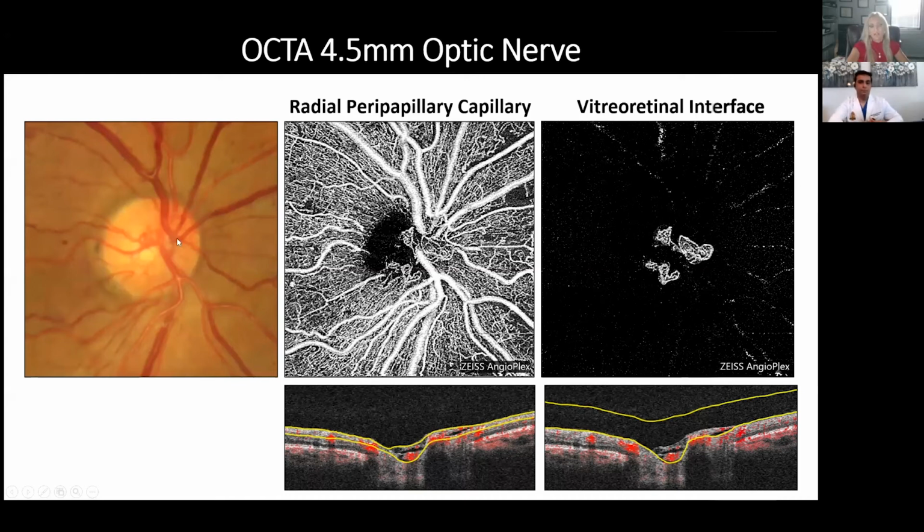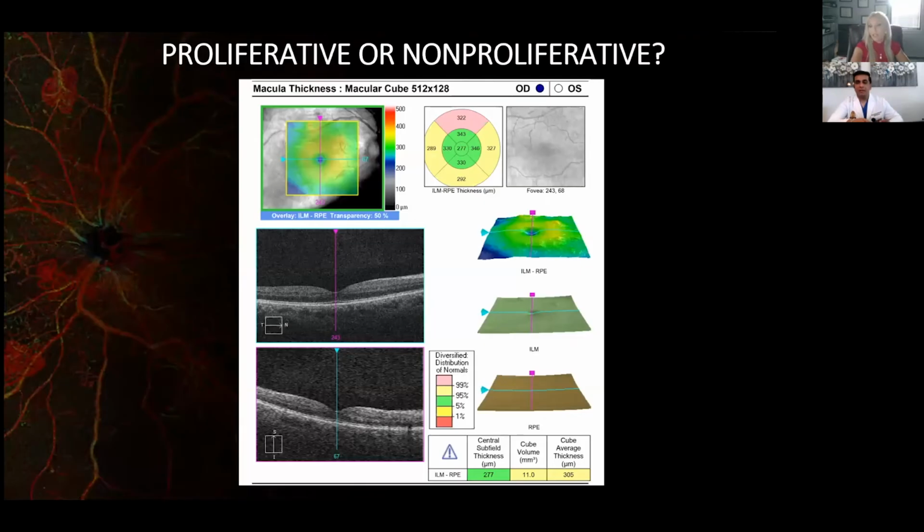What I think is surprising is that this area here, to me, kind of looks fibrous. I don't really see any obvious neovascularization on the disc, but then there's a very large area of neovascularization there that just really isn't easily visible unless you do OCT angiography. These are the patients where you had to wait for staining of the angiogram for the really late phase pictures to even find it. So it's amazing you can see them non-invasively now. And much faster, right? You don't have to take images at 5-7 minutes to look for late leakage on fluorescein angiography. We're able to just get it in a few seconds, taking an OCT shot.